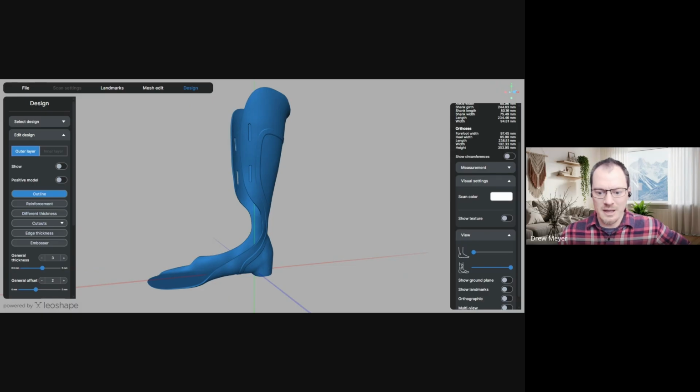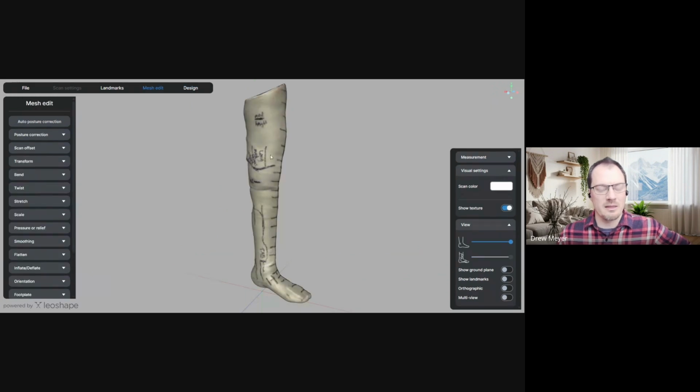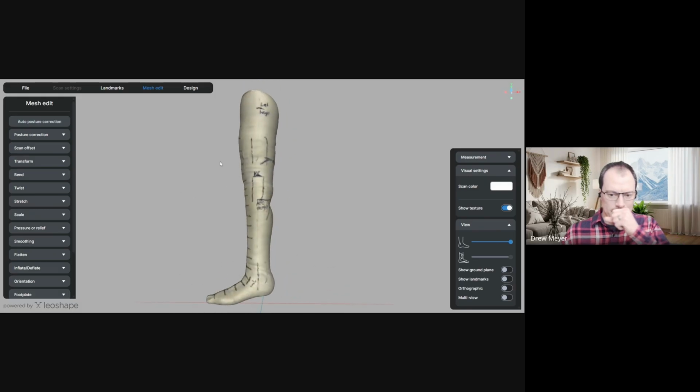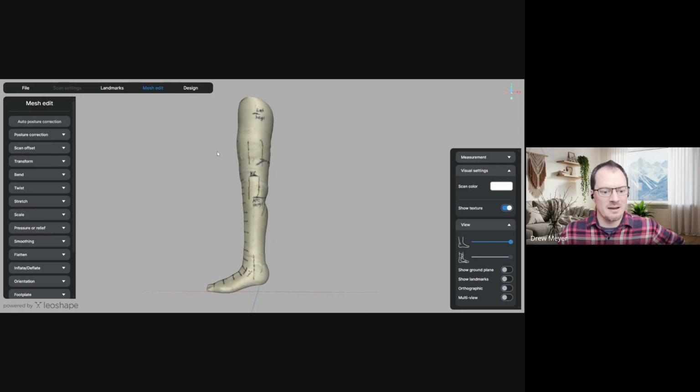Okay, and last but not least, I wanted to do a little sneak peek into the KAFO world. So this is something that is available for beta testing if you're interested. Right now, it's mainly supporting CNC workflows. So it's going to be something where you're going to be carving this afterwards. It's not for printed devices yet, but that's something that we're hoping to add. And it's going to work and it's going to look and feel the same way as LeoAFO.